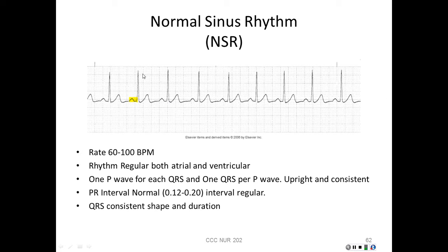Checking your rhythm is very difficult, and there's no way I can show you on the computer. But basically, you would take a piece of paper, lay it down, and mark on that paper here and here. Then you would slide that paper to see if these are regular. If the marks on your paper match up with each one of these, then your rhythm is regular. Don't try to eyeball it. On your computer screen, you can do that, but be careful when you put your pencil up there. Do not puncture the screen of the computer.